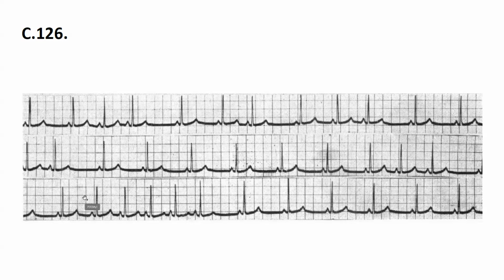Is there sinus activity in this graph or not? Yes, this is sinus rhythm. These are the sinus P waves, and here there is no P. So this is what he asked: whether this is a sinus arrest or an SA block, and how we can distinguish them based on the 12-lead ECG. I said we cannot. But let's assume it's an SA block, okay?